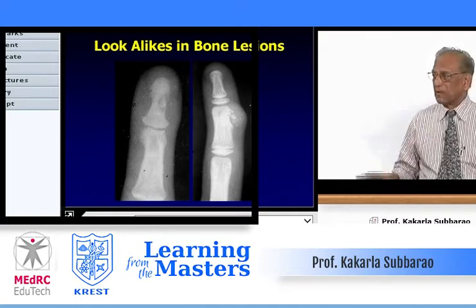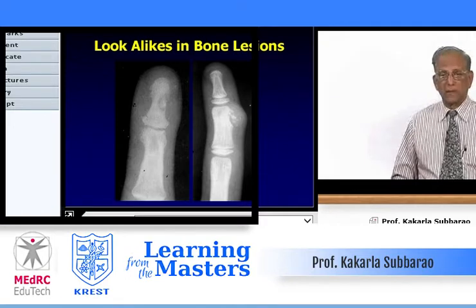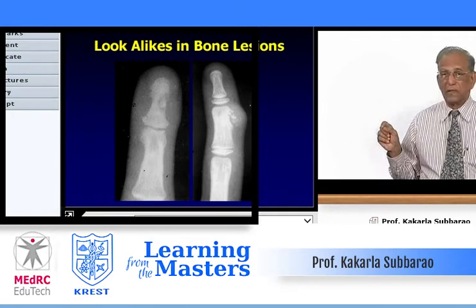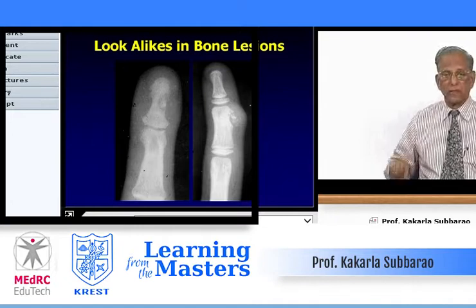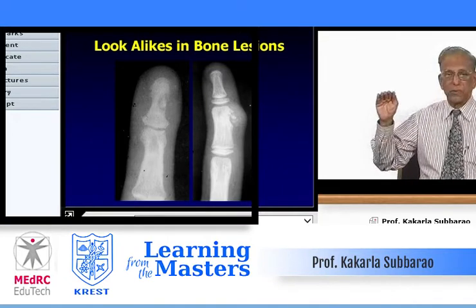One on your right side, again, a child. The epiphyses are not closed. Again, you find a calcific density. Here, there are multiple calcific densities. The swelling is localized, not diffuse like that which you saw in the left finger. And then there is a hook-like process superiorly.